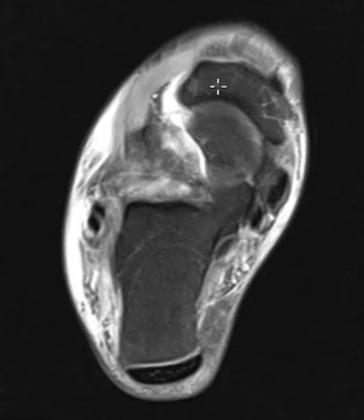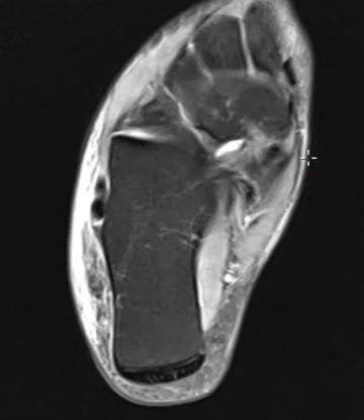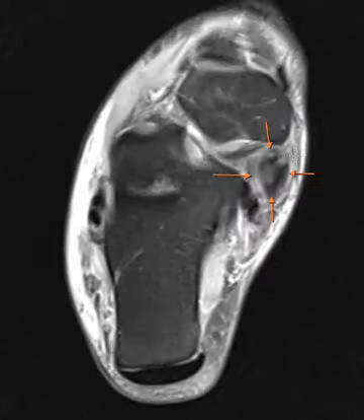As we approach the navicular bone here, we're going to see it look abnormal. So there it is, looks foggy. Right at the attachment it can fan out and look broad and bright, but this is just too bright, too thick, and the increased signal is starting too far away from the navicular attachment. And then here's at the attachment, we just don't see it. So this is a torn posterior tibial tendon.